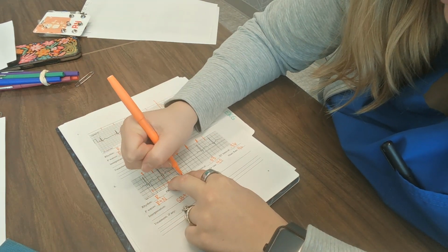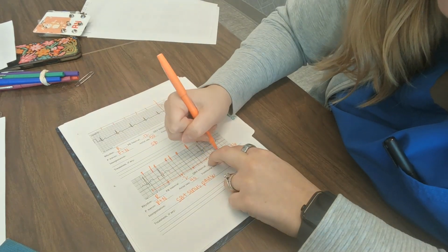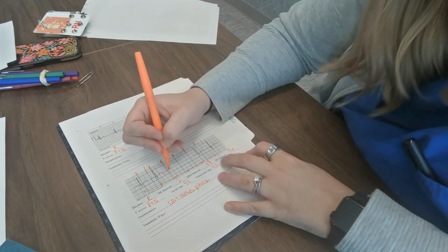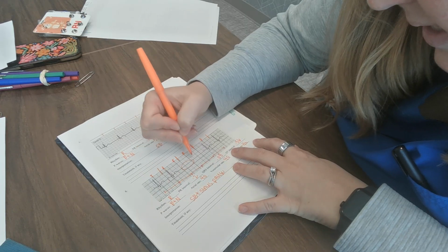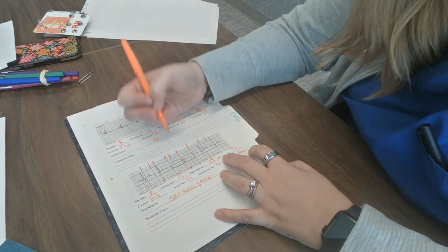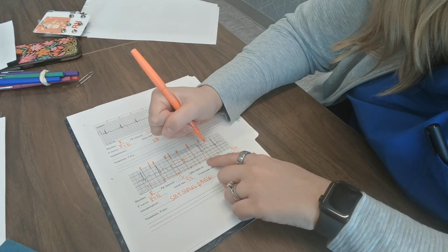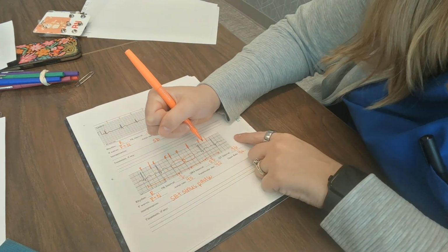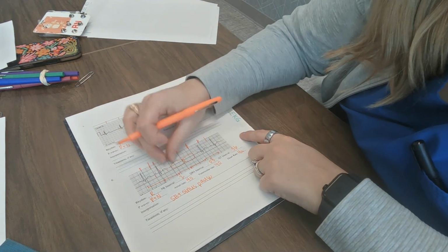Well, if I draw that again here, here, and then it picks up being normal after that. So we have this one missing and this one missing. So it's 2 R to R's, and then it goes back to normal. It catches up back on its baseline.